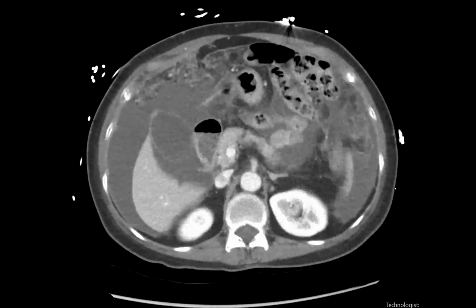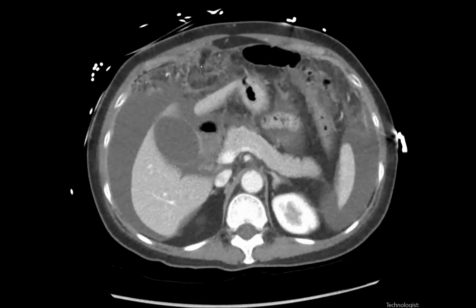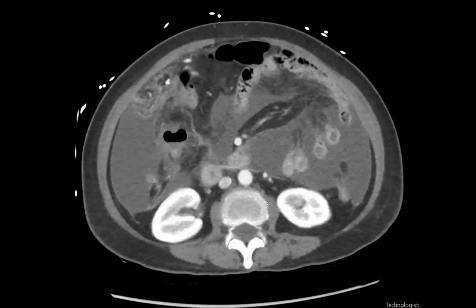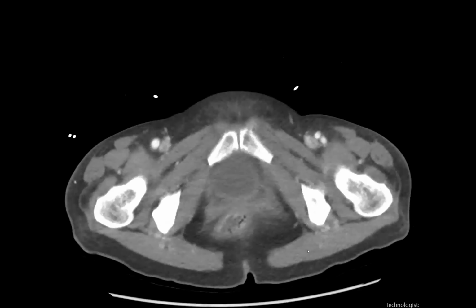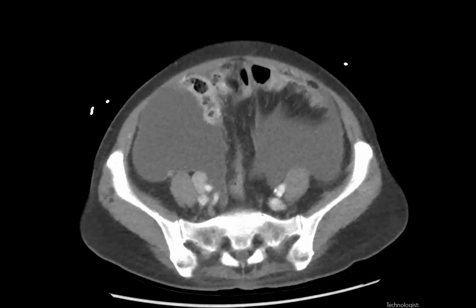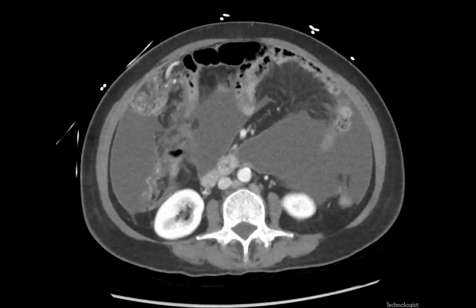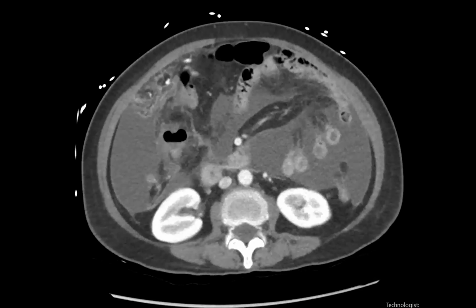Okay, so here is a patient with peritoneal disease. You can see that there is all this induration and nodularity of the omentum and ascites. And in this case, it was from ovarian cancer. We don't see the primary ovarian malignancy anymore. There were some retroperitoneal lymph nodes as well, and they underwent 3 months of chemotherapy.